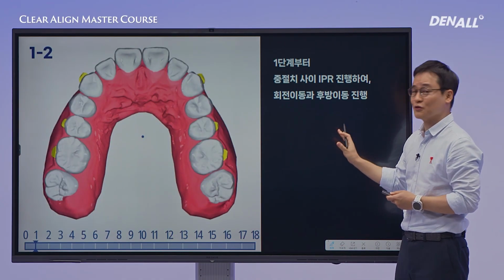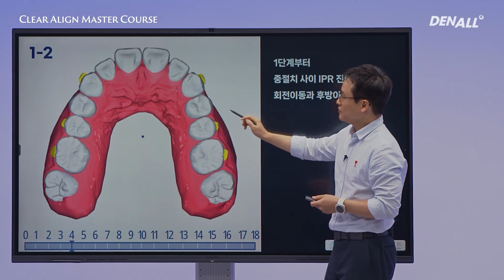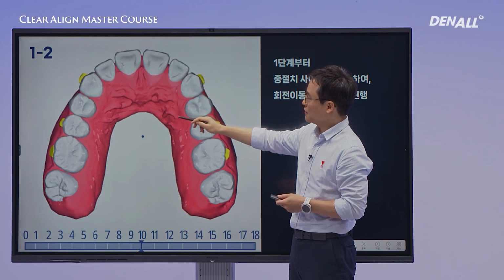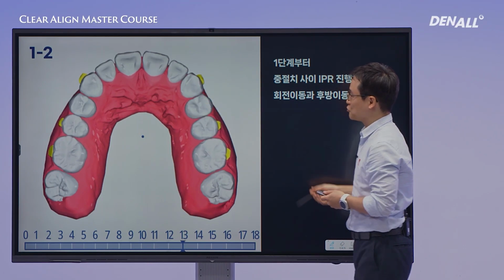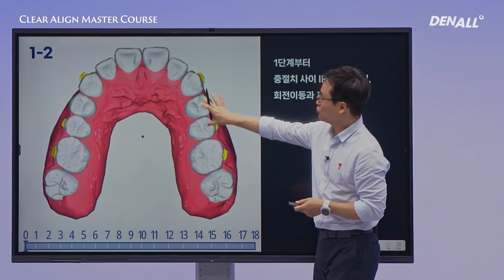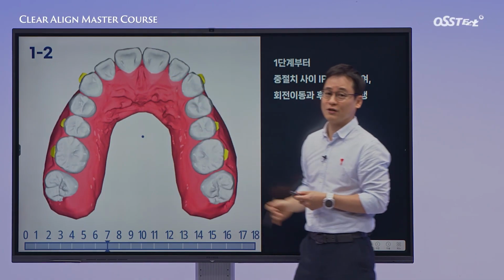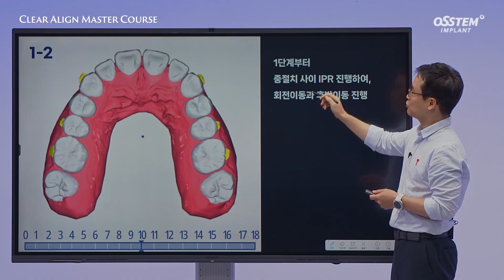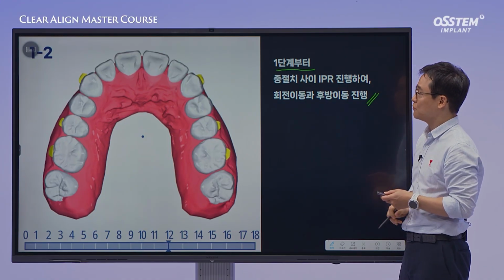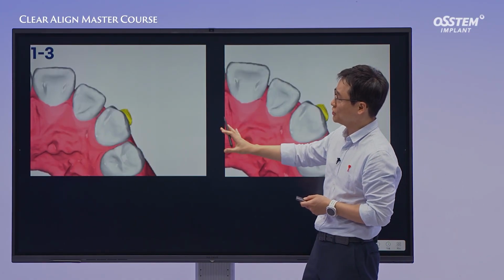After analyzing the area more specifically, take a close look at the simulation of the maxillary central incisors. The maxillary central incisors were delayed in movement. Although they could have started from stage 1, they only began moving later after other teeth had already shifted. Movement could have been initiated from stage 1, so I requested that this tooth movement start from stage 1. This is an example of the modification process we go through. Once applied, the outcome changed accordingly.